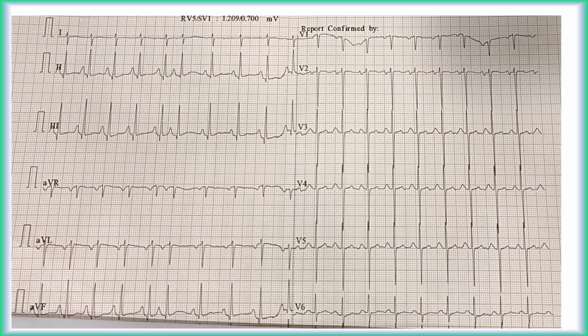In this ECG, lead V1 and V2 have prominent negative deflection in P wave. Question is how to know whether this pattern is due to left or right atrial abnormality. If you look closely, lead V5 shows prominent S wave, which is a sign of right ventricular hypertrophy. Moreover, P waves are tall and pointed in limb leads, and it is tallest in lead AVF, indicating right axis deviation of P wave axis. Both these features are seen in COPD patients. Hence, this prominent negative deflection of P wave is due to right atrial abnormality.